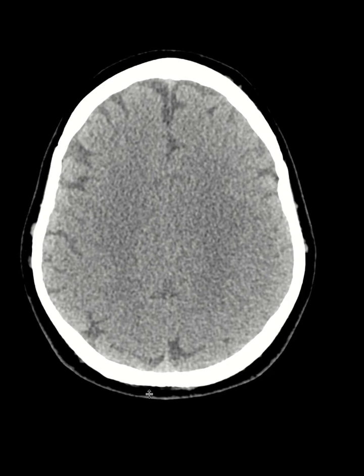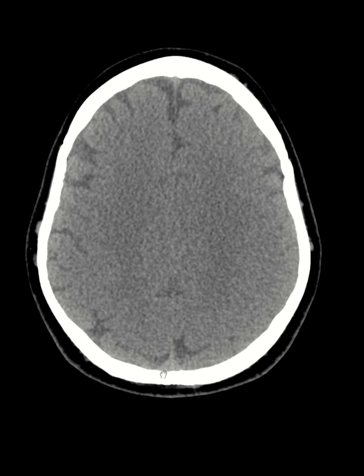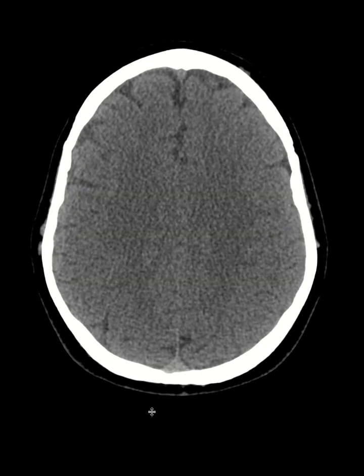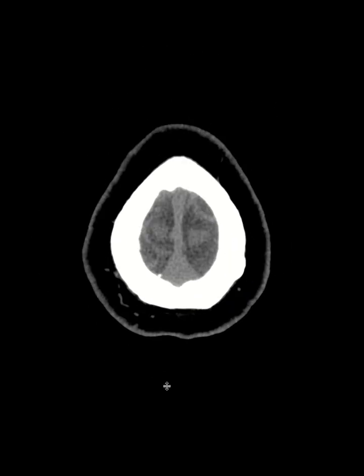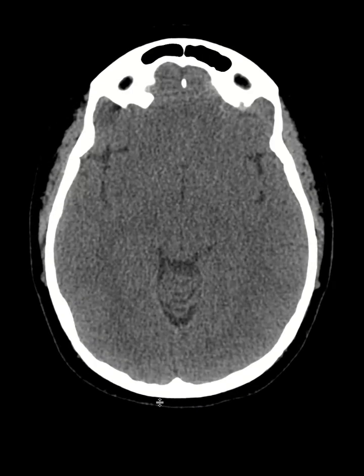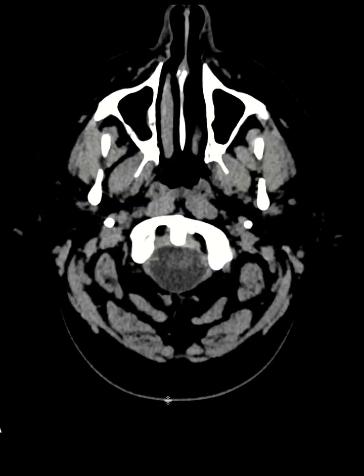This patient was a 40-year-old female who presented with some sort of head trauma. So basically they were looking for a bleed or any other things that you would expect for a patient from a fall. If you quickly look at this head CT, I don't want to spend that much time, but you see that this looks like a very good brain for a 40-year-old, right? And I don't see any abnormal intracranial hemorrhage or anything.